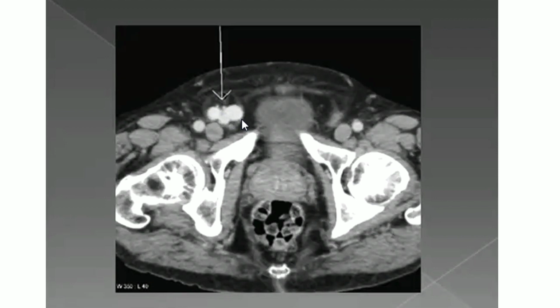Ma'am, these could be vessels. Excellent, yes. Or it could be through the spermatic cord, so it can be enhancing vessels. Yes, causing the varicocele later on in the scrotal region.